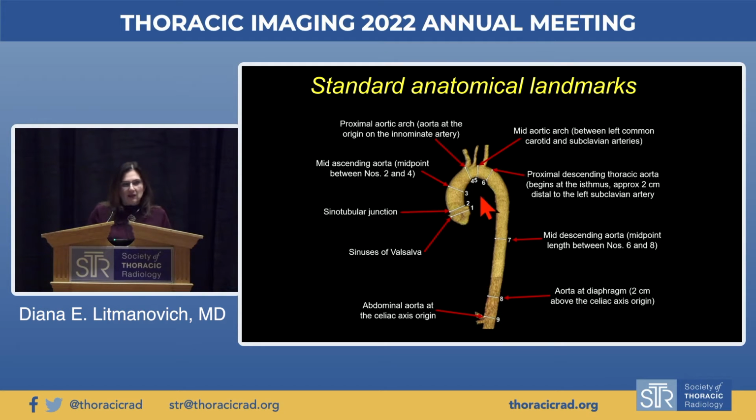Now, some teachings and some approaches designate the thoracic aortic arch with an asterisk, and there was a great publication by Dr. Charlie White and his younger colleague, I'm blanking on his name, who was talking about it. And sometimes it is important to mention that we are not talking just about the descending aorta, but about the aortic arch. But if we are talking about ascending versus descending, this is our landmark.